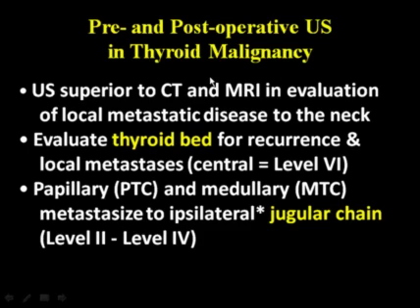So let's talk about pre- and post-operative ultrasound in thyroid malignancy. Again, I stated previously that ultrasound is superior to CT and MRI in the evaluation of local metastatic disease to the neck, and this is specifically in patients with differentiated thyroid cancer. Other head and neck cancers, this does not apply.